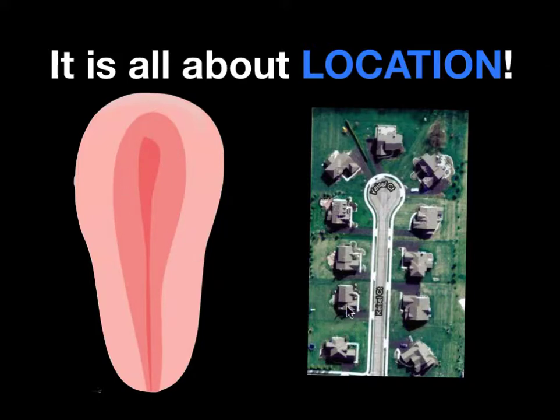And you can see here, this is where the homes are built, that there's some border between the road here, and there's also going to be a border here looking at these as being the backyard here at the endometrial myometrial border. So remember, it's important to assess where the pregnancy is implanted.